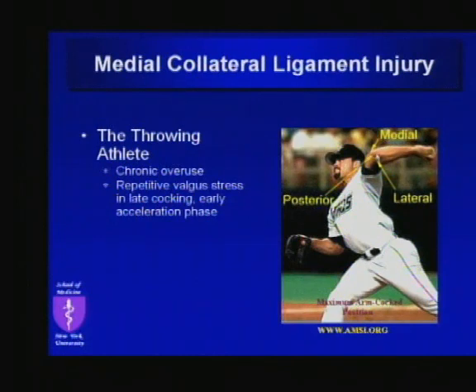That's depicted here. You can see that this is an unnatural position for the elbow. We're cranking open the medial joint line. We're placing a lot of tension there and stress on the medial ligamentous structures. We're closing down and impacting the lateral compartment.